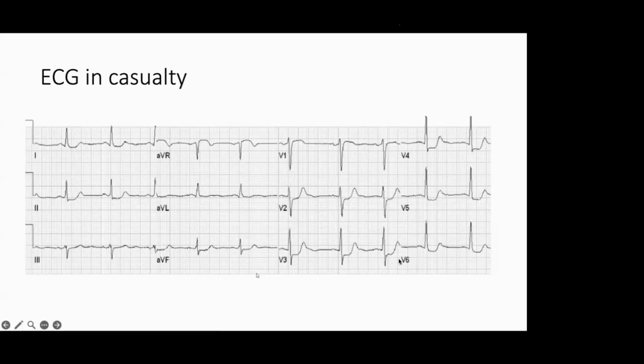Can anyone read the ECG? This is actually subtle, going to ST elevation. This is a STEMI pattern. It is associated with increasing T wave height corresponding to the R wave height. QRS is coming down, R wave going up. There is ST elevation and corresponding ST depression in the inferior leads. It is an evolving anterior MI.